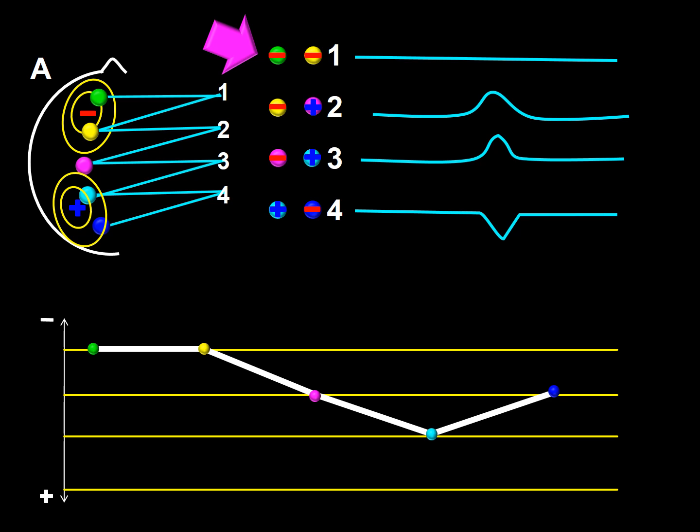The tracing, despite being generated by two voltage sources, has only one instrumental phase reversal, a fact that can also be noted in the potential graph. Such situations occur when one of the generator maxima is recorded at the first or last channel of a chain, or, as it is in this case, when the maxima is at an equal distance from each electrode at the end or the beginning of a bipolar chain.